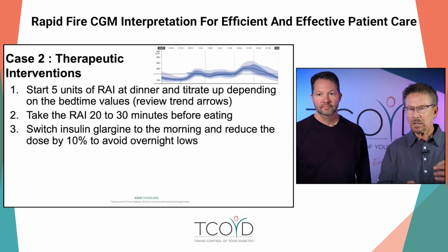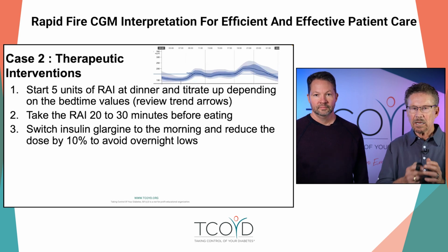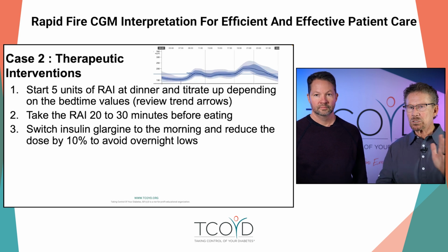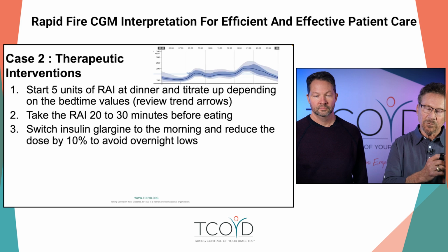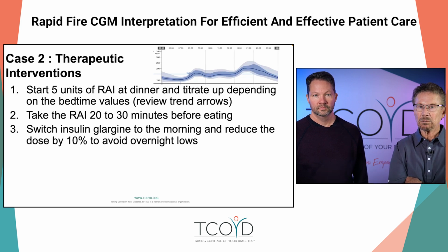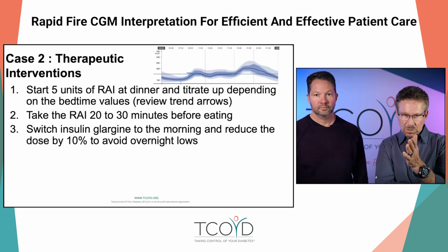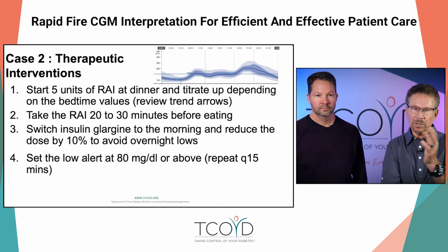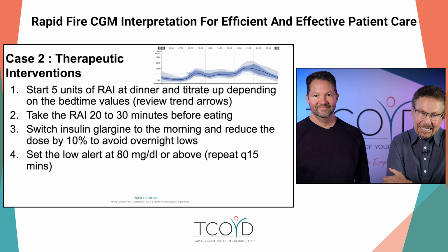And the other thing that I think is kind of a more difficult thing to recognize is that I wanted to reduce his glargine by 10%, but I changed his dose to the morning because we do know that it kind of wears off the last 3 to 4 hours of the 24-hour cycle. And that way I wanted to reduce that 5% below range by doing those two strategies, lower the basal and change the time of the day. And my therapy isn't always exactly perfect. So this is what I did.